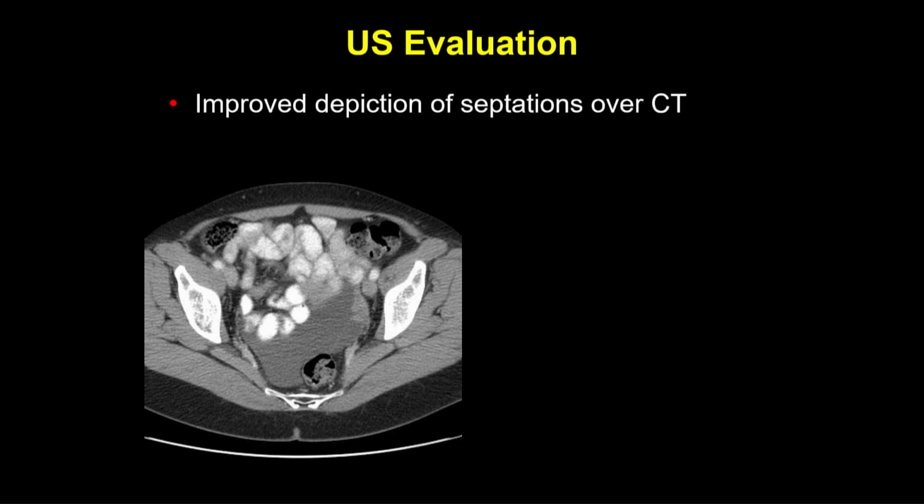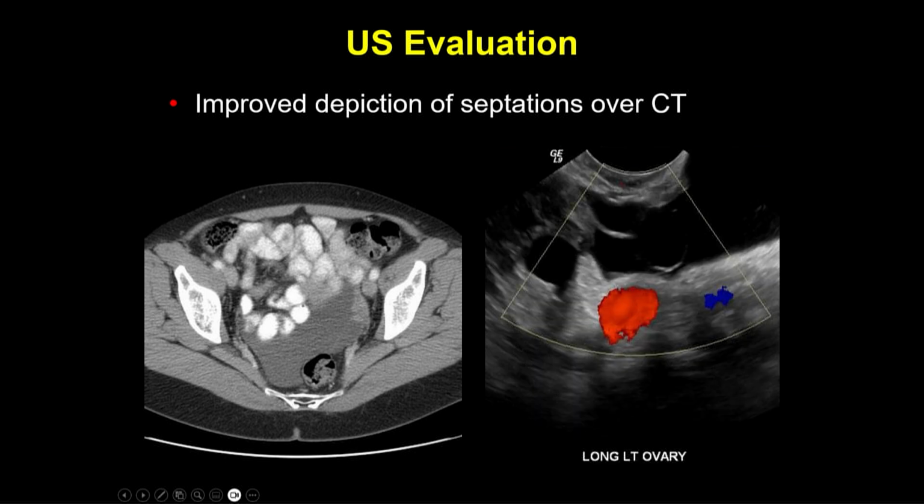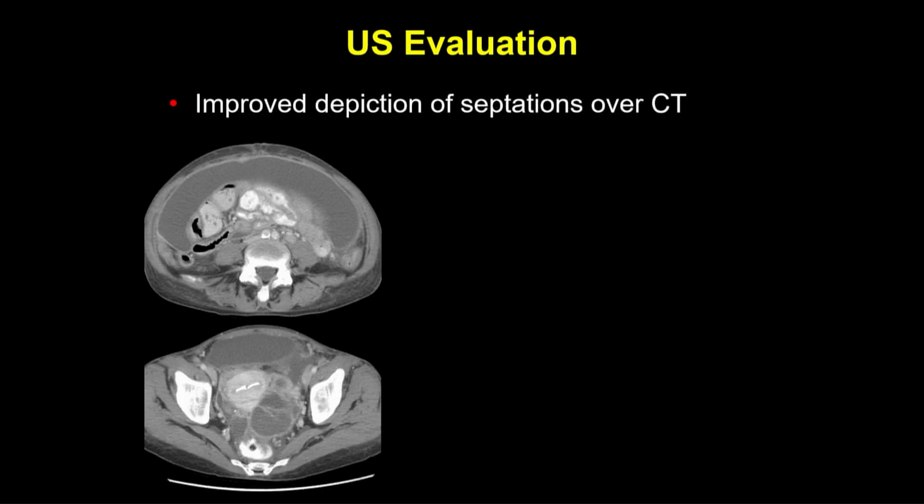This looks like fairly simple peritoneal fluid here, but there actually were a bunch of septations in this patient with benign cystic mesothelioma. The more you look, you can see lots of septations. This is another case where it looks like it's a big single loculated collection, no problem. Drain it, put a drain in there.